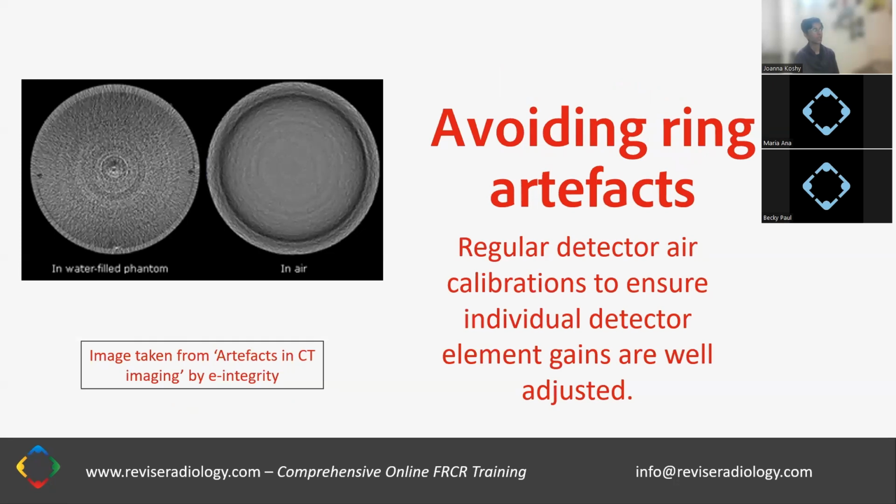You can see it in a water-filled phantom or in air. These images are taken from Artifacts in CT Imaging by E-integrity. So how do we avoid these type of ring-shaped artifacts? We have to do regular detector air calibrations to ensure that individual detector element gains are well adjusted.